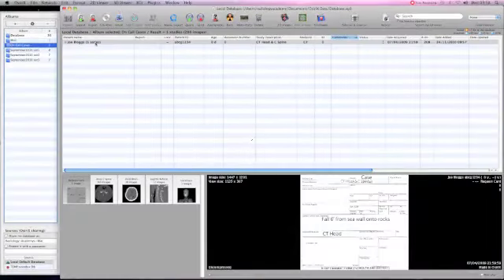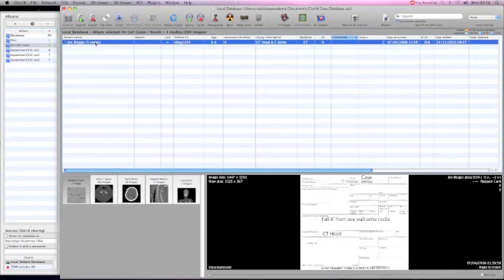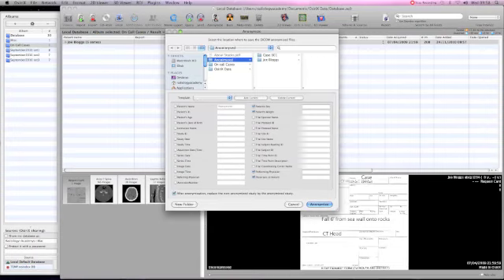There is a quicker way to anonymize a folder. If we click on Joe Blogs and we anonymize, we identify patient name and ID, along with all the other parameters we've already described. We identify the case again as case 001, and put in another entry under patient ID.